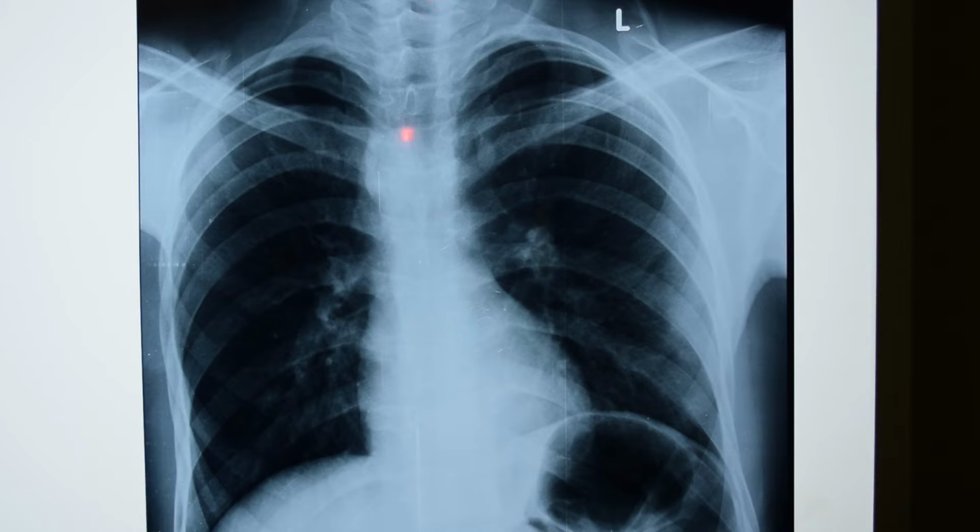Starting from here, this is the airway, which is also known as the trachea, and it is always central in position. Behind these white are vertebral bodies. These are thoracic vertebrae up to here. So this is the trachea, main trachea, right bronchus, left bronchus, and this is the right clavicle, left clavicle.